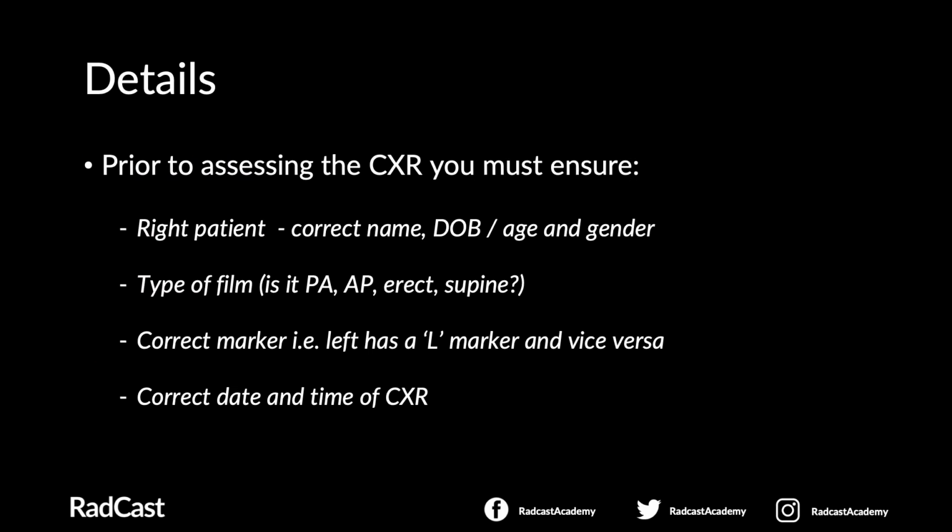So let's start off with the details. Prior to assessing any chest X-ray, you must ensure you have the right patient's X-ray. So the correct name. Is it the correct date of birth or age of the patient and their gender? Look at what type of film it is. Is it a PA film? Is it an AP film?